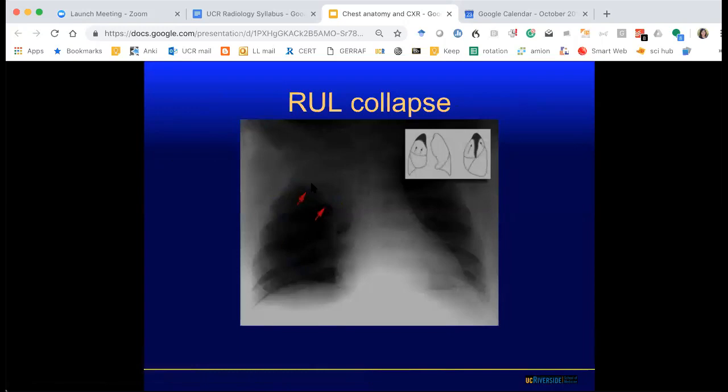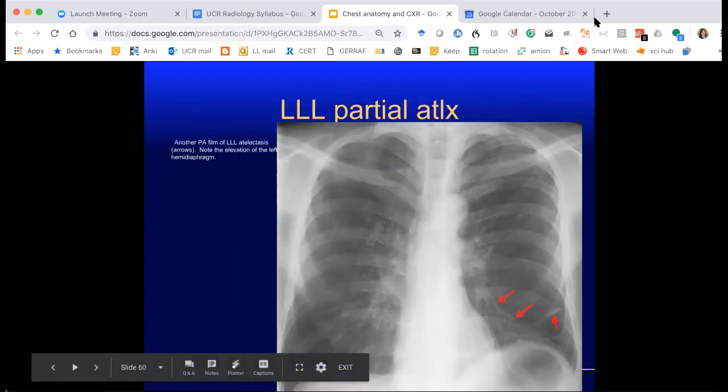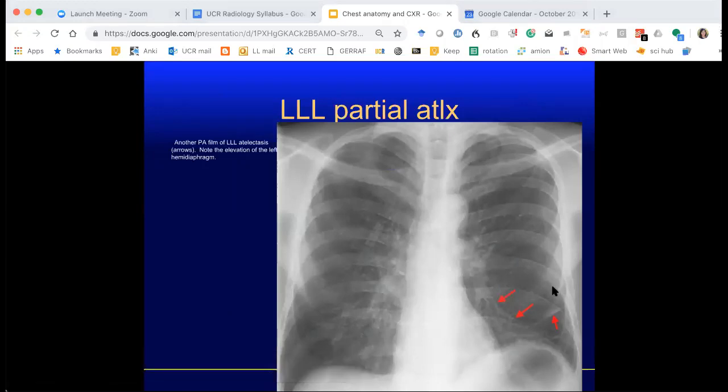What about the hump along the left heart border on the atelectasis picture? Oh, yes. So the question is about this hump. It's an artifact because we see it on both sides. It's a scapula. So here's a scapula here. You can see that scapula here. So it's just from overlapping shadows that there is this appearance of a hump.